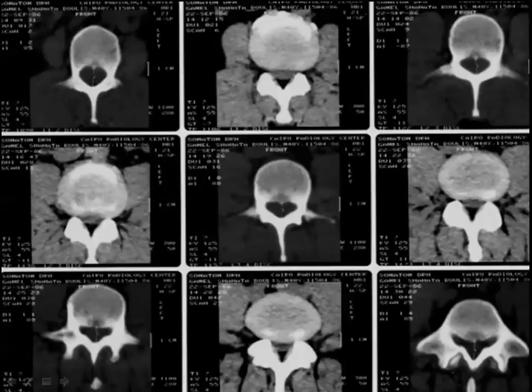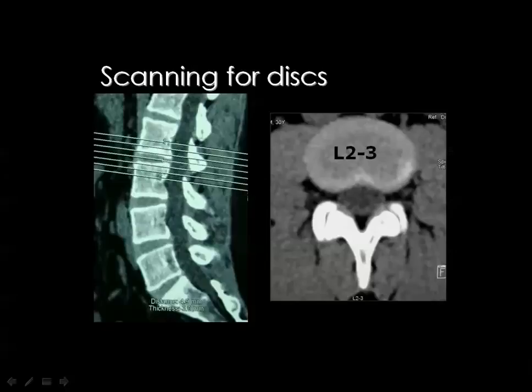Then you know that the diameter of the spinal canal may be normal at some levels and narrowed at other levels, and you should mention this in the report. Then the second issue is to evaluate the disc for any abnormality. You know that for a disc level, we include part of the vertebra above and part of the vertebra below, as well as scanning the disc itself.